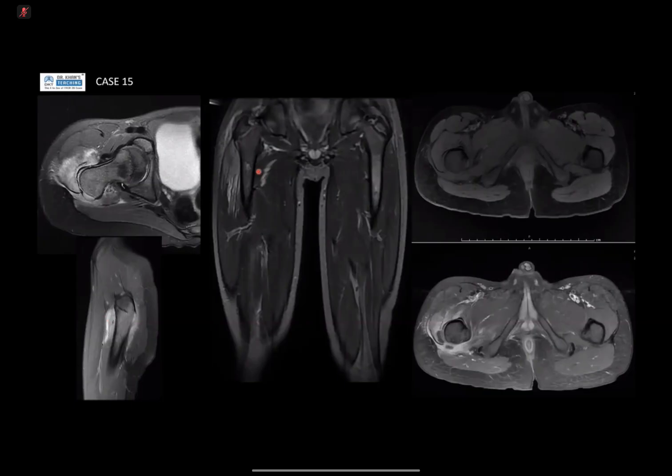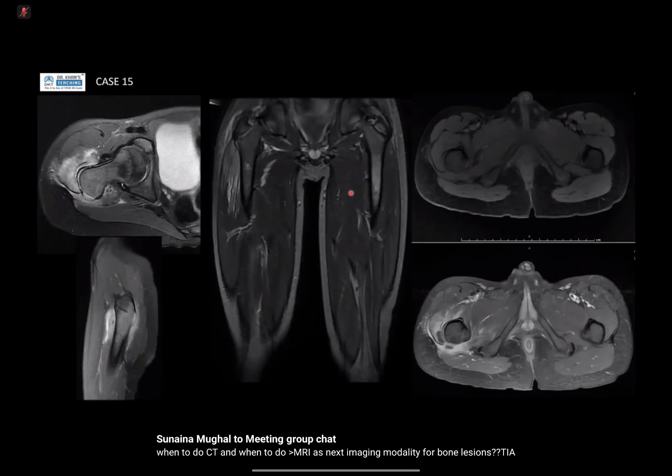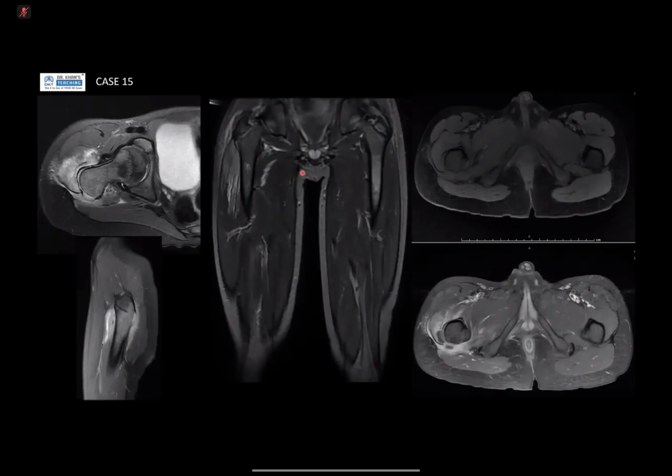Now, things to be aware of: in osteomyelitis in adults, your T1 is your friend, because focal areas of low T1 signal suggest a marrow process, which is infection or malignancy, and it should be iso or hypo-intense to muscle, which suggests a marrow abnormality on T1. But in kids, you've got red marrow, which makes things a bit difficult, so T2 is your friend. And of course, in kids more than adults, infection is one of the top differentials, osteomyelitis, which is why we often give contrast.